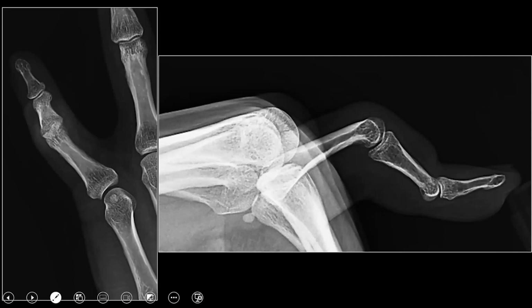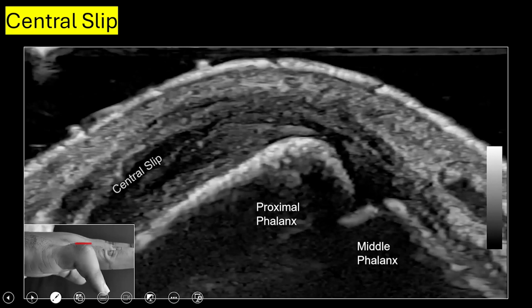So that's the radiograph. And as I said, never sacrifice the radiograph in favor of high-tech imaging, because sometimes most of the diagnosis is made on the plain X-ray, and the clinicians do not require any advanced imaging technique for the treatment purpose.